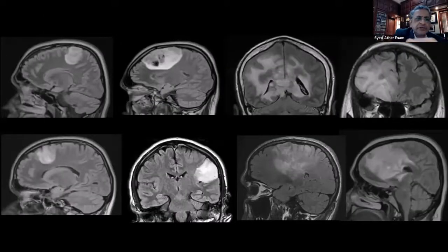So there are circumscribed and infiltrative types of low-grade gliomas. You see over here, this suggests very clearly that the central sulcus will be somewhere over here probably. Well, we don't know exactly, maybe over here. And this extends mainly in the frontal lobe, because the central sulcus will be something over here. This is mainly in the frontal lobe here. This one is right above the operculum, and in here, this is infiltrative, which is going on both sides and is crossing into the splenium as well.